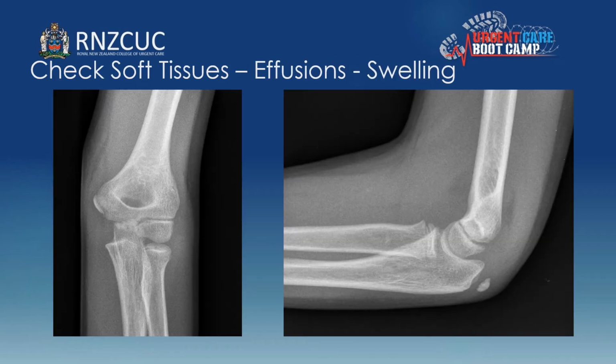So look for swellings. On the AP of this elbow on the left hand side of the screen, you can see that there's significant swelling there, which indicates there might be a little bit more going on there. And on the lateral you can see that there's a large anterior sail sign and a posterior effusion. Now you can get a small sail sign, probably about a third of that would be still normal. However, a posterior sign is always pathological.